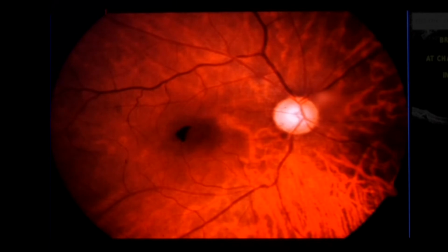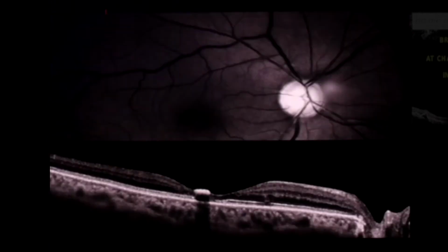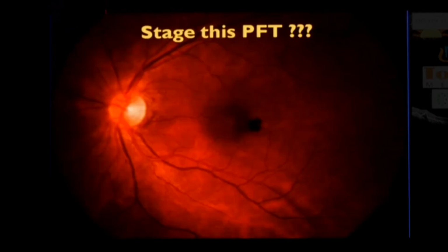The moment you see it, you can make a diagnosis of stage 4, and mind you, these pigment hyperplasias need not happen only in the middle layers. They can happen in the inner retina. They can move all the way up superficially, and they can be anywhere in between as well. On clinical evaluation, we can think this is stage 4 disease just because of the pigment hyperplasia. And we all know that pigment hyperplasia usually engulfs the area where there's a dipping of the vessel.